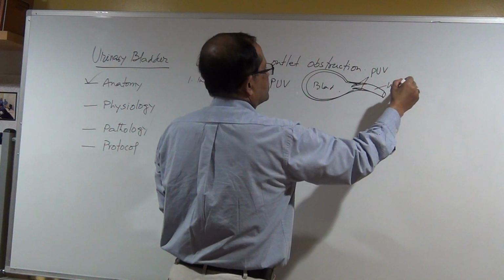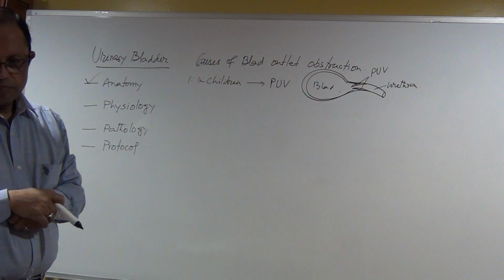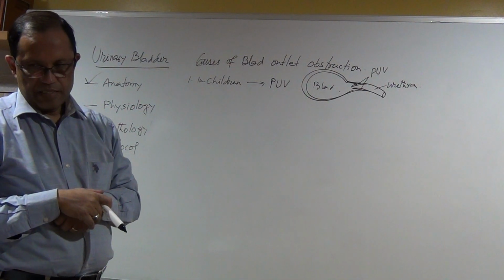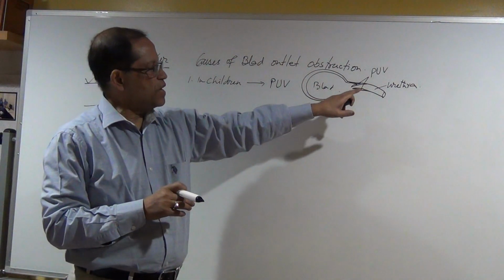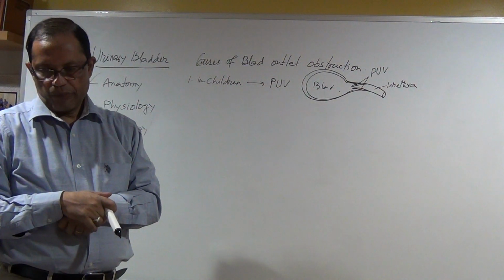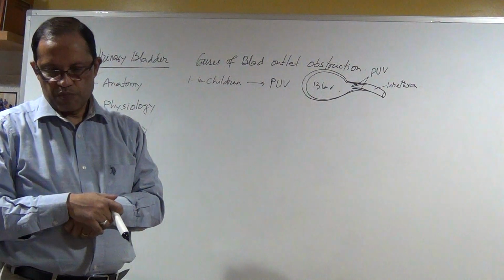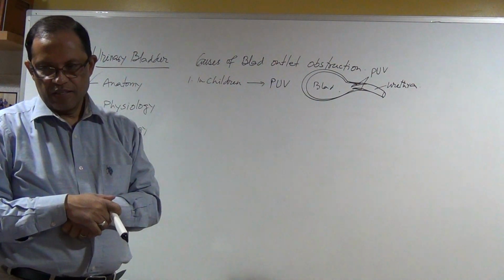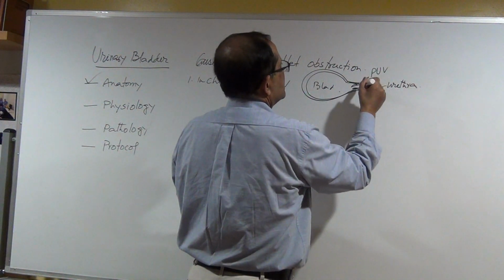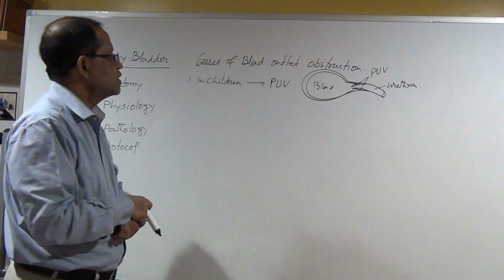This is the urethra. It is congenitally present. The baby is trying to pass urine, but the gate is closed. Prognosis is good. The urologist will insert a cutting scissor, cut and clean it, and the problem is gone.